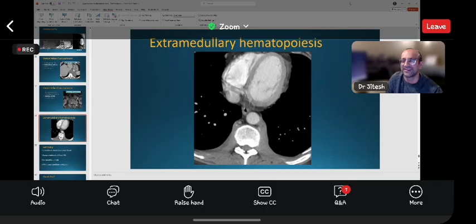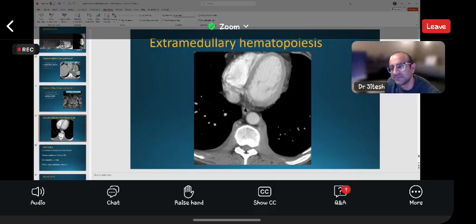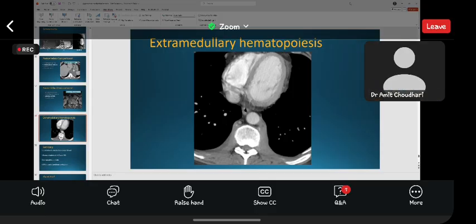It's not a mediastinal abnormality, right? Yes. And that's fat, definitely. Fat-containing lesions: thymolipoma, mediastinal lipomatosis, liposarcoma. Any heads up as to differentiation between these entities?